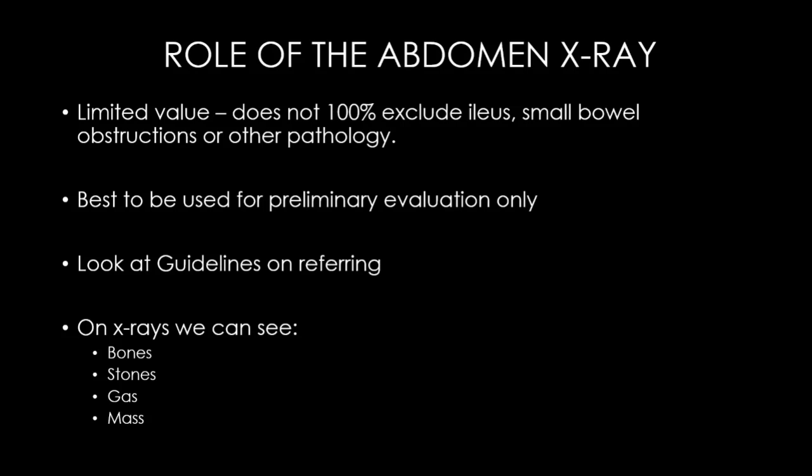Typically, you do an erect chest x-ray for perforation. We do it erect or upright just because the air rises. Typically, you'd see that below the diaphragm, between the liver and the hemidiaphragm on the right side. As you get more gas build up, it then starts to be showing on the left side and centrally as well.